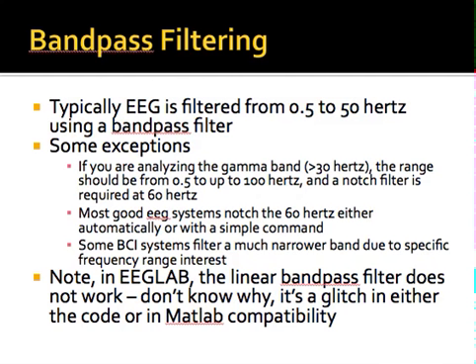One thing to note is if you're using the most current form of EEG Lab and the most current version of MATLAB, for whatever reason the linear bandpass filter doesn't work. I don't know why. It's either a glitch in the code or it's a glitch in the current edition of MATLAB, or both, and how they communicate. So to bandpass, you have to run a low pass filter first and then a high pass filter if you're using the linear option. If you use the nonlinear option, it's not a problem.